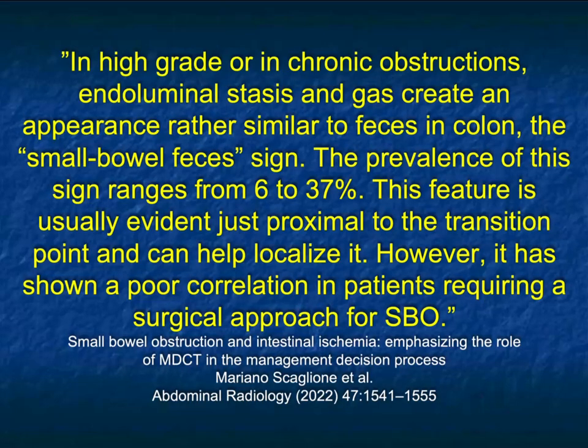So I like the feces sign. When it's there, it's very helpful, pinpointing where the transition is, and then you go from there. But it's not always going to be there.